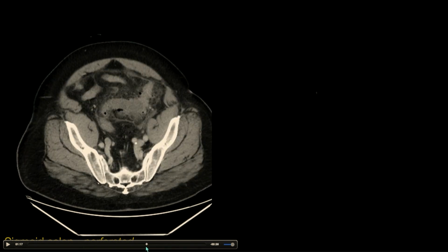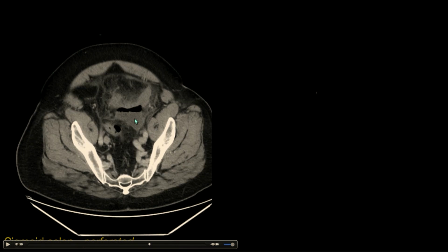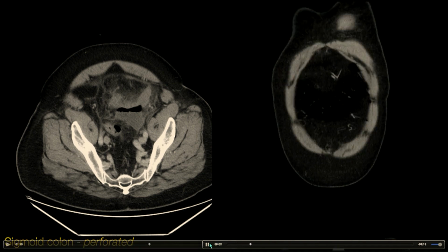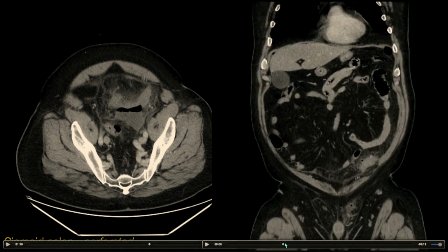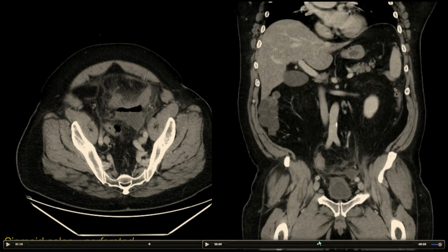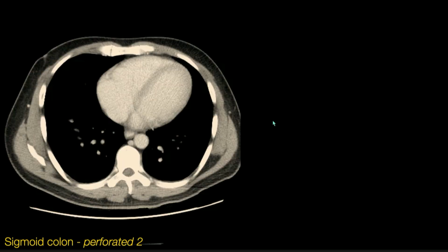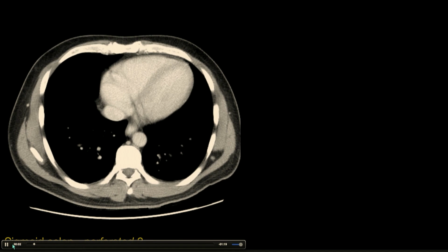Finding the perforated diverticula is often very difficult, because you can imagine the diverticulum gets obstructed and then it perforates, forming this thin channel that's communicating with the bowel, but otherwise is obscured by the surrounding inflammatory findings. So don't let the fact that you're having trouble finding the culprit diverticulum throw you off. If you're seeing that this patient has a bunch of diverticula and then a characteristic appearance of perforation, you can make that diagnosis. We'll cover a couple more here.